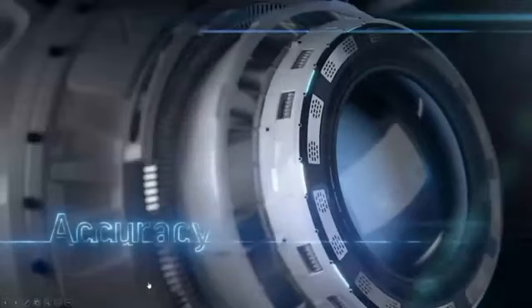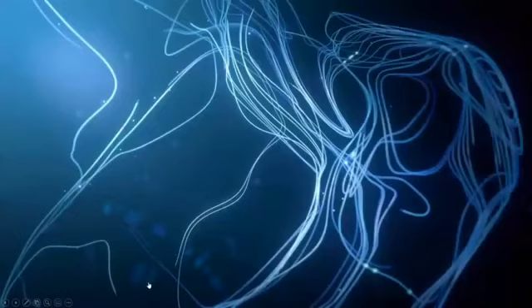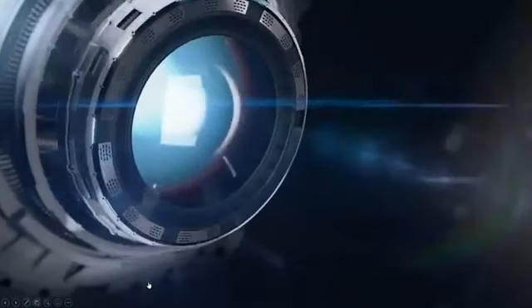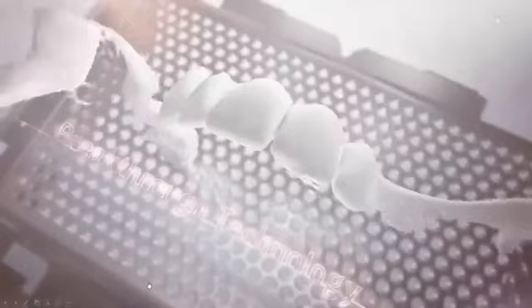Welcome to our second NextDent by 3D Systems webinar during this COVID-19 lockdown. After our first webinar focused on all functions of 3D Sprint, we are now going to explore one of the most exciting applications for 3D printing, in our opinion, and that is the full digital 3D printed dentures. A little different approach today, as we will combine live software demonstration for CAD and 3D Sprint, as well as virtually take you to our training center in Soesterberg in the Netherlands, where we can see the printers as well as post-processing and finishing of the denture.